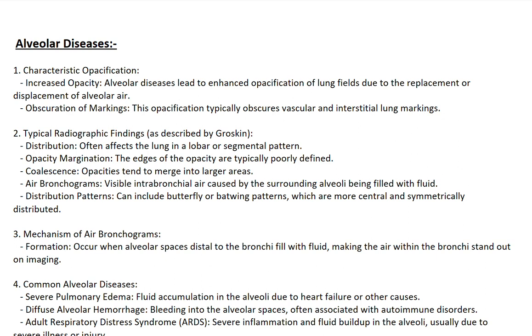Point-wise description of alveolar diseases. 1. Characteristic opacification, increased opacity. Alveolar diseases lead to enhanced opacification of lung fields due to the replacement or displacement of alveolar air. Obscuration of markings. This opacification typically obscures vascular and interstitial lung markings.